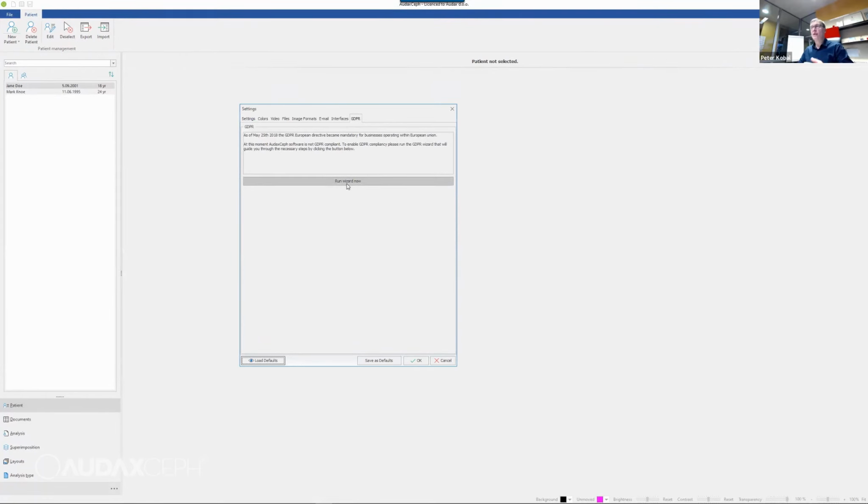And from here, I can encode all the files, and what we can do is place a password, so username and password, but do not forget it. Do not forget it. If you are working outside Europe, please check your legislation, check the requirements about the medical documentation which are in power in your country, and act accordingly.